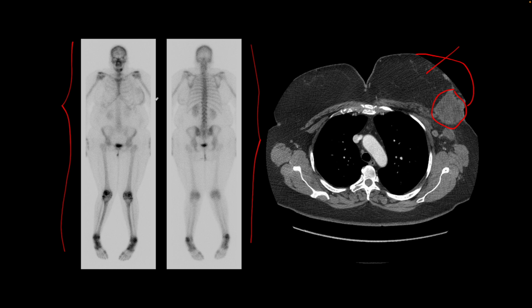The interesting finding here is that there is some hyperemia-related uptake of MDP seen in the left breast tumor and also in the left breast skin thickening. So remember, tumors have increased blood supply, and because of that hyperemia, there can be increased delivery of technetium-99m MDP, and we can see that faint increased or asymmetric uptake, especially when compared to the other side.